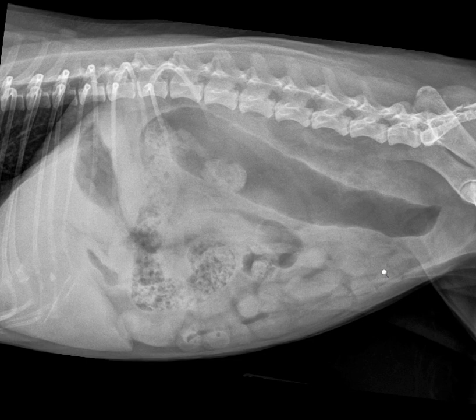On the other hand, CT examination can be valuable to give a full assessment of all of the abdominal features, including retroperitoneal fluid, peritoneal fluid if present, and gastric mural features. So both would be great options for this case. Be sure to review the full report associated with this case.